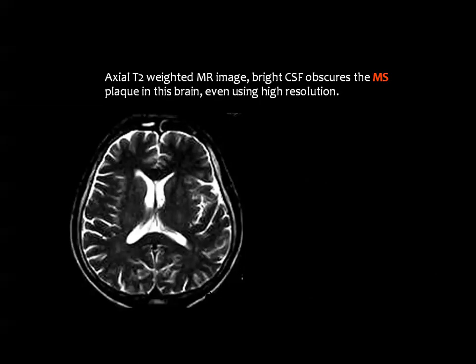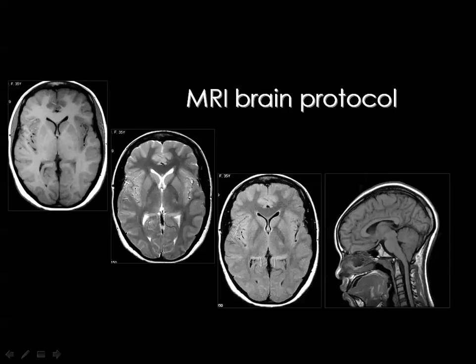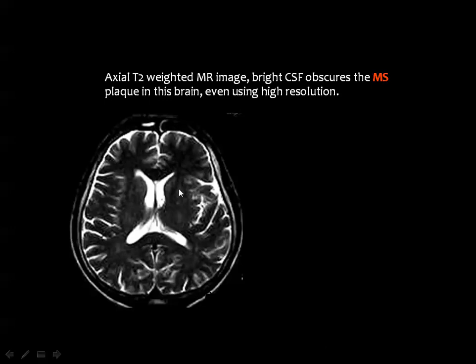I have mentioned that the regular protocol of the brain includes the axial T1, axial T2, and the axial FLAIR images. What is the value of the FLAIR images? Let us look at this axial T2 of an adult brain with a lesion adjacent to the ventricle in this area.